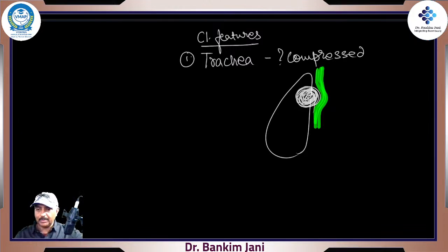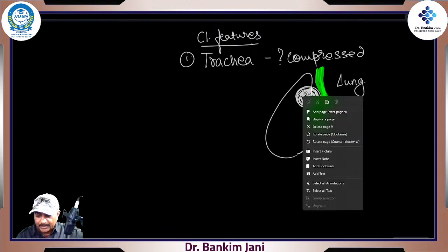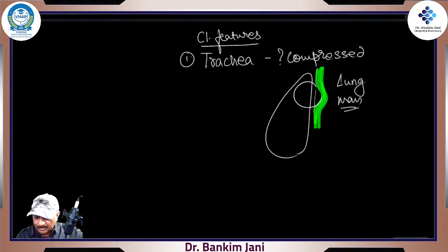But right now we are not dealing with it. So this would be the lung mass, anything which is coming out from the lungs. So carcinoma. And what if it is from the lungs? Inside this mass, we'll be able to see the bronchovascular markings because it is lung tissue. Make sense, right? So BVMs, bronchovascular markings, they would be present in this. We'll see all this in this space occupying lesion.